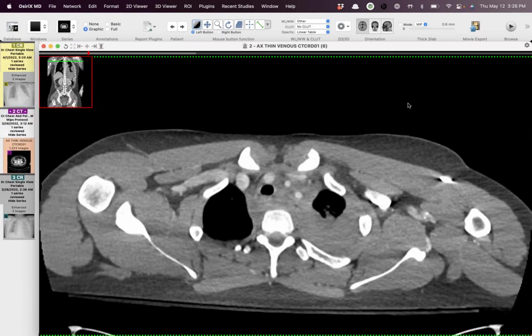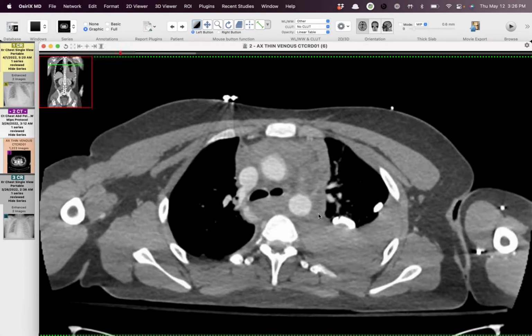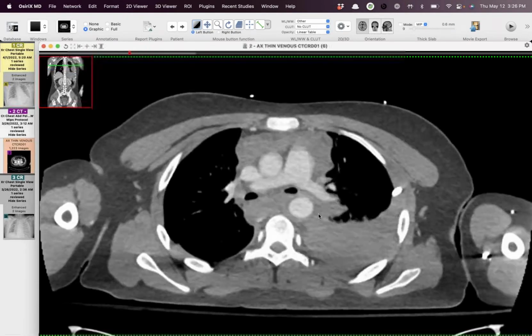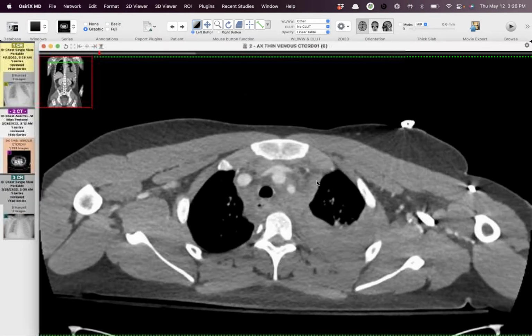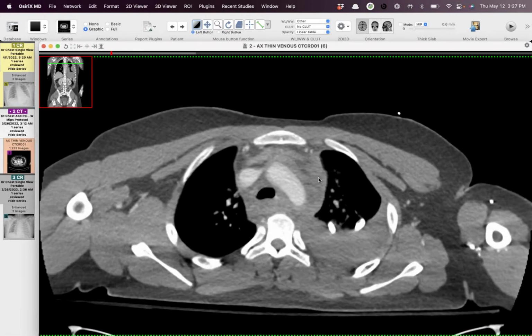Okay. Well, and then also dissecting into the extrapleural space, so it's really an extrapleural hematoma over the apex. Yeah. And that's the same space that pneumomediastinum goes into and gives you pseudopneumothorax. Right. So yeah, that's a good point. You just peel off, if you have something behind the mediastinal pleura, that becomes continuous with the parietal pleura that goes over the apex. And so between the parietal pleura and the endothoracic fascia, I would think, yes, at least along this portion, yeah.